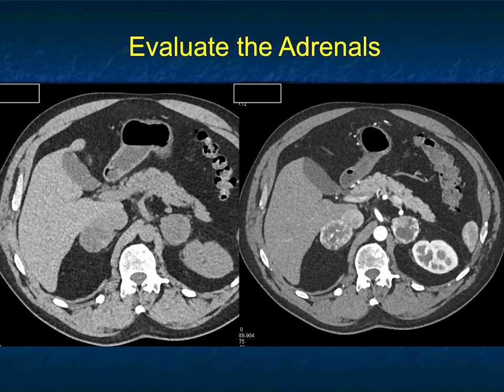What about this case? On the non-contrast, there are bilateral adrenal masses, and you can go from adenomas to metastasis to lymphoma to pheochromocytoma. On the image on your right, they're very vascular. Now I'm stuck with two things, metastasis or pheochromocytoma. I know it's unfair because you only have these two images. You see the left kidney, you don't see the right.